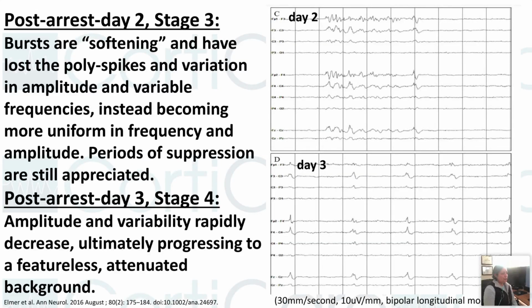On day 2, the bursts are softening. That means the high voltage that we are looking at is resolving. The background is still suppressed. The bursts are now sharply contoured mixed frequency activity.